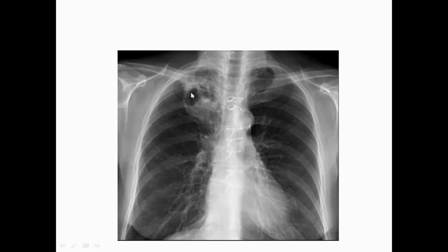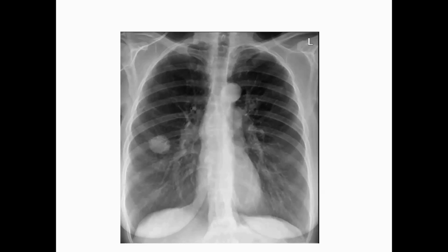So these features were of a cavitated lung mass of lung cancer. We're going to give a differential diagnosis: could be lung cancer, could be TB, could be an abscess, could be a fungal mass. But to be honest, these features more likely point to lung cancer. So we're going to advise in your report for further scanning, which is the CT scan, for better clarification and differentiation.